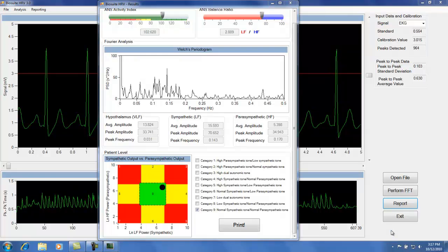for folks. Okay, almost last but not least, we have the entire spectral data that is given up here. Some individuals like to see that, some docs like to see that, and especially if they're doing research, they're interested in that particular data, so we left that in the report sheet.